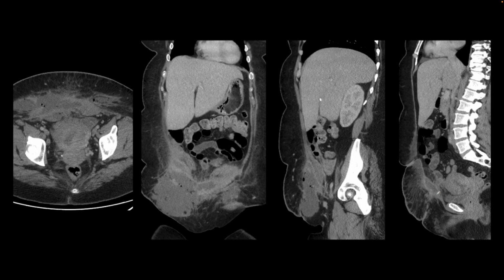This is our next patient who presented with abdominal pain, fever, and chills. We performed a CT abdomen and pelvis. We found that the uterus is enlarged. We have a scar here. They had a recent C-section, and there is this fluid collection with foci of air and some peripheral enhancement in the abdominal wall at the site of the C-section scar. And so this is a developing abscess post C-section.